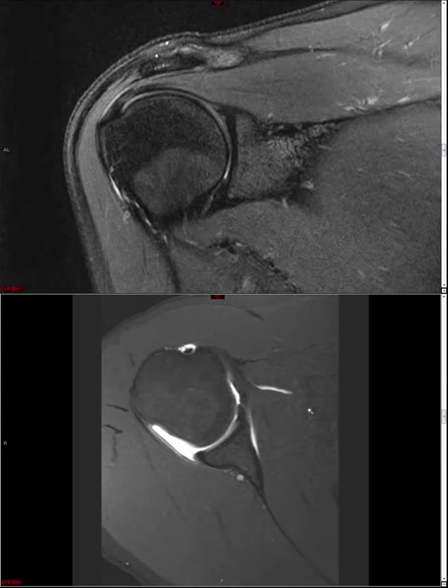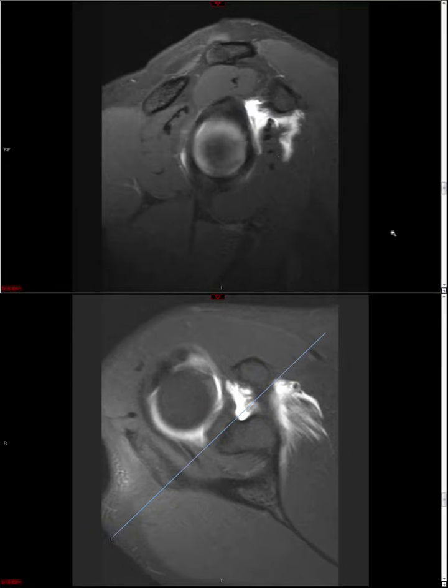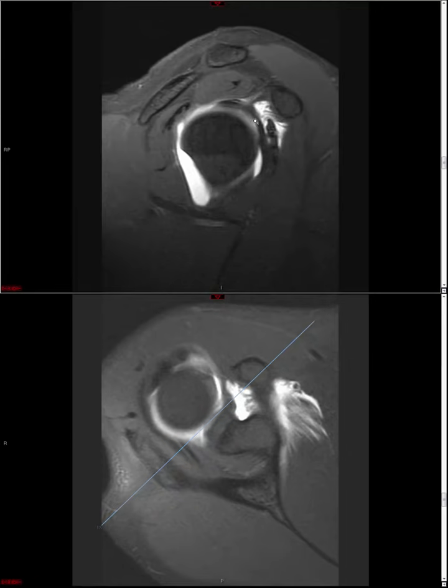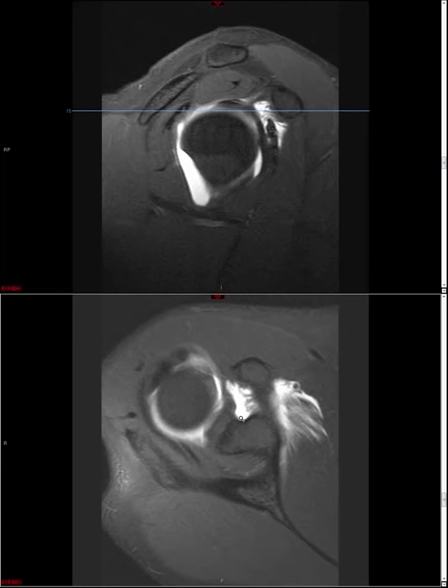And that's, I think, pretty much a nice brief overview of labral assessment. I mentioned very briefly the middle glenohumeral ligament, and we talked about how it's a thick band interposed between subscapularis and the labrum. It usually comes off from the anterior labrum, supraglenoid. It can come off lower, and unfortunately these glenohumeral ligaments tend to have variability in terms of where they originate, and also their caliber, and whether or not you actually see them.